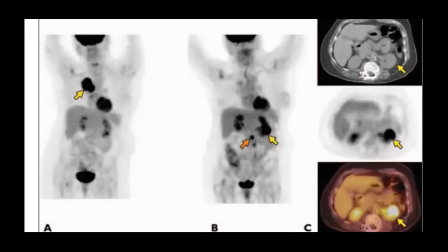So he took chemotherapy, he took radiation. Yeah, with metastasis. You can see even on the CT, there is obliteration of the renal cortex and the sinus fat.